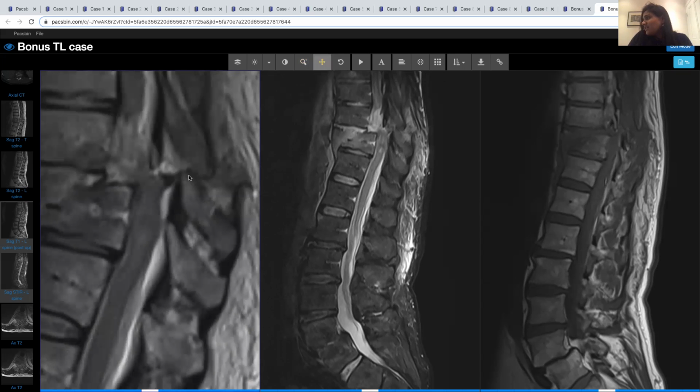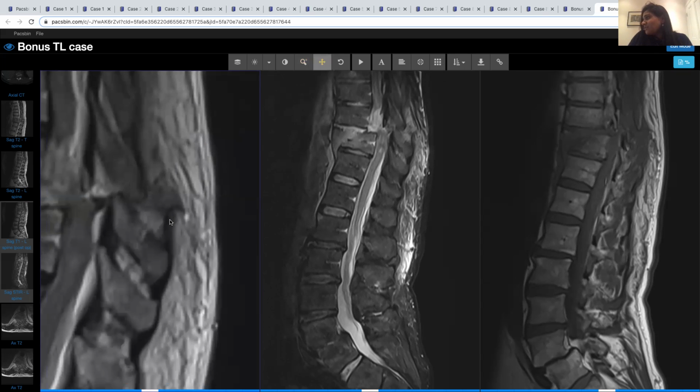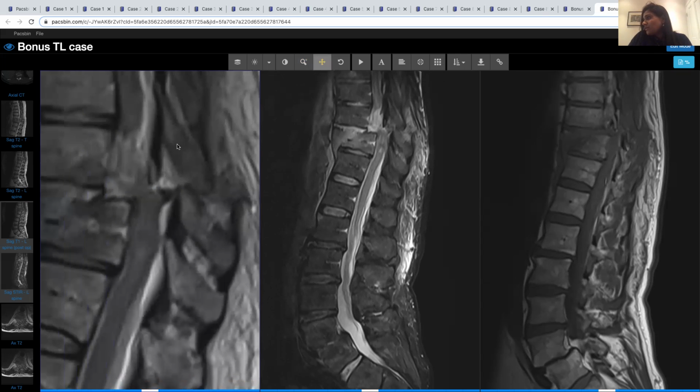Here you can clearly see that there's edema within the interspinous ligaments at that level as well. So the interspinous ligaments are gone. And here is this supraspinous ligament, and it's flapping about in the breeze here. So here is focal disruption of that supraspinous ligament.